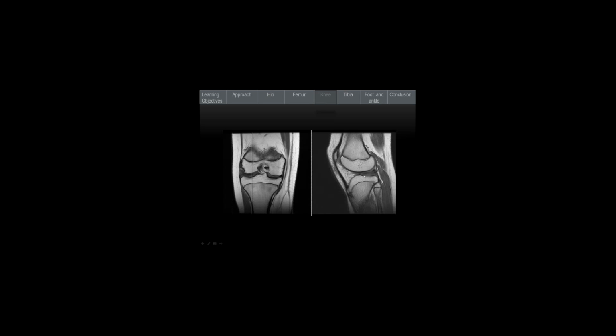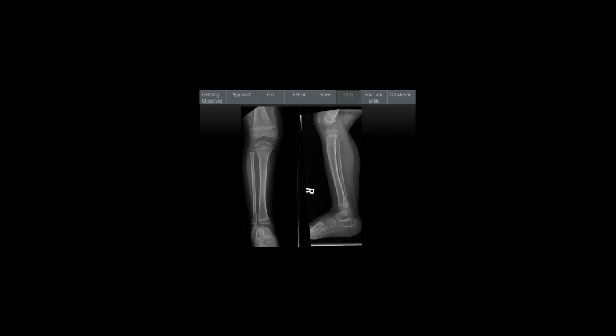This is a case of a discoid meniscus. Children with chronic knee pain, and sometimes they'll have a specific joint line tenderness laterally. With an MRI, we can diagnose a discoid meniscus, which is an abnormality anatomically of the meniscus that typically will require resection. Otherwise, it will lead to long-term pain in that child.